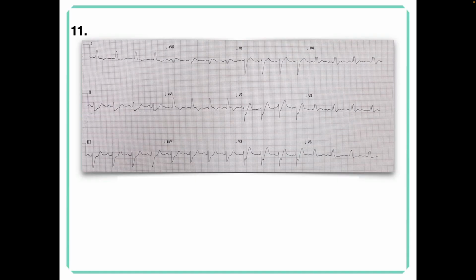Number 11, Anne, please. I'm seeing for Sgarbossa B, depression in V2 and V3.